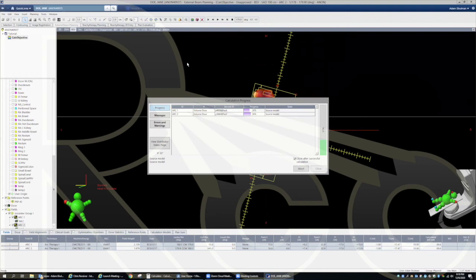Just a quick question. I noticed that you're using 6 MV. Do you think that you could have used a higher energy on these cases? Oh yeah, that's a good point. I think a 10 MV would have worked great. Probably better. I think I just took whatever is there. It's the previous amount used. I didn't really even think about it much, to be honest with you. But that's a good thing to point out to everybody. So for pelvises, for prostates, I think it's fine to use 10 MV. If I'm going to be planning something in the lung, I'll use 6 MV.